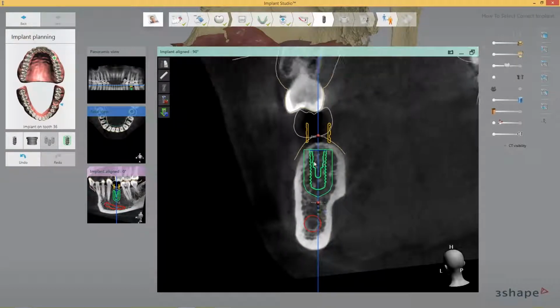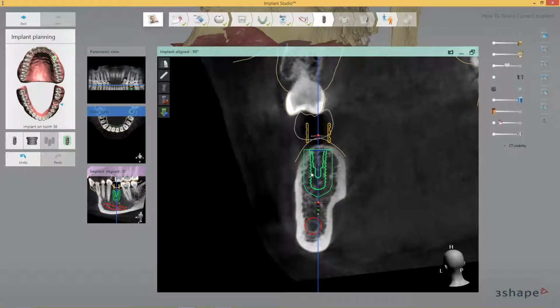And also the safety zone, there are some minimum values we can put in, but the user can basically decide what safety zone they feel comfortable operating with, to a certain degree, right? That is correct. If you are comfortable, you can change the safety zone for all your plannings, for all the implants you do, in the settings. But you can also change it just specifically for this implant. For example, if you need to squeeze an implant in and it's very thin, but you need to do it, and if it turns red, everything is stopped.